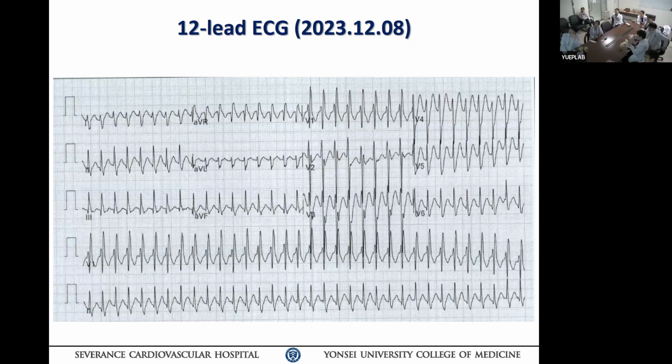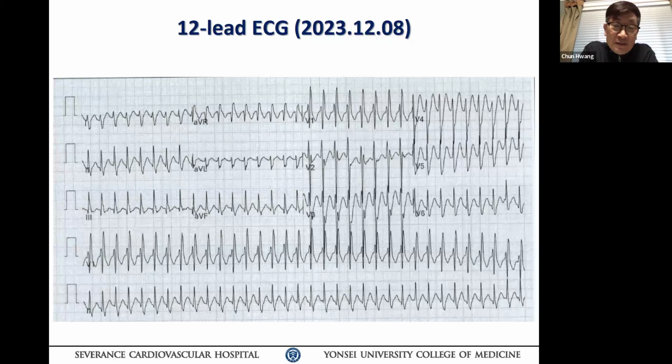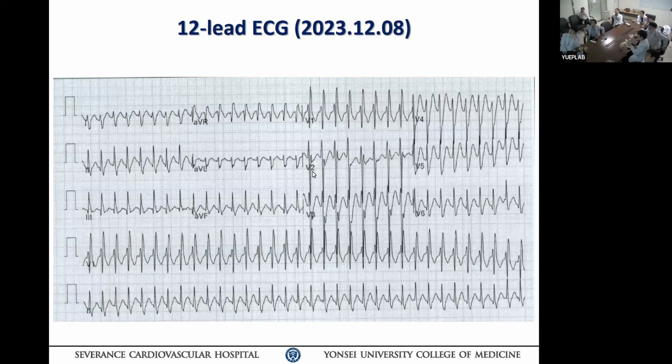이니셜 40ms에서 보통 리드 2나 V6에서 보이는 Q 웨이브도 있었다 없었다 하는 게 SVT의 가능성은 조금 떨어져 보인다고 생각을 합니다. 적어도 히스 그 아래에서 오리진이 분명히 될 것 같습니다. Right. 그러니까 우리가 지금 생각해야 될 거는 we need to prioritize what is our differential diagnosis.